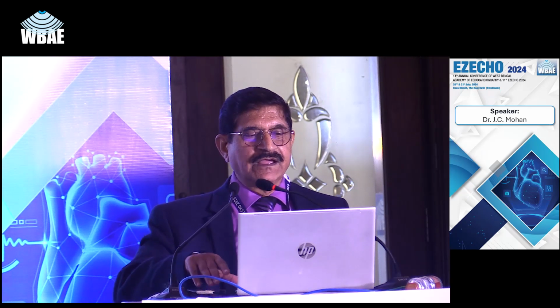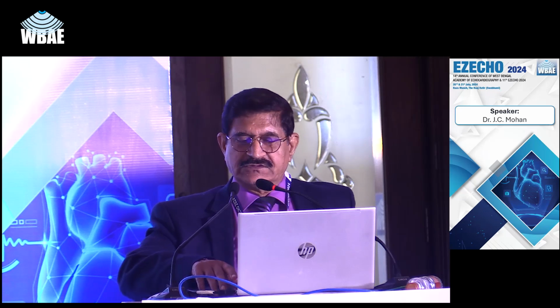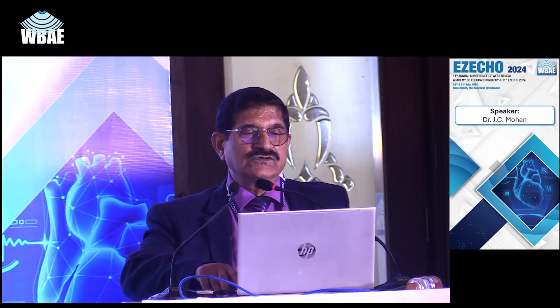Good LV function. If you see the two-chamber cine, you would say yes, the ejection fraction looks like 64%. And of course, both atria are enlarged, which is suggestive of HFpEF.